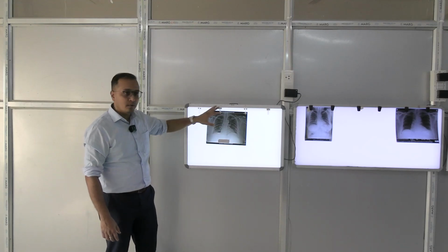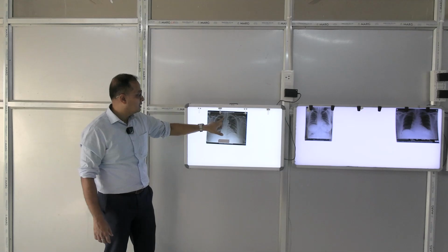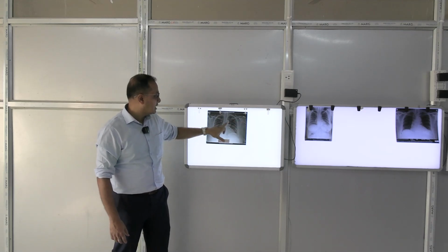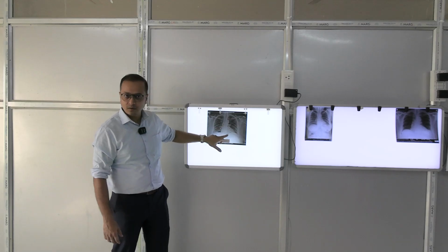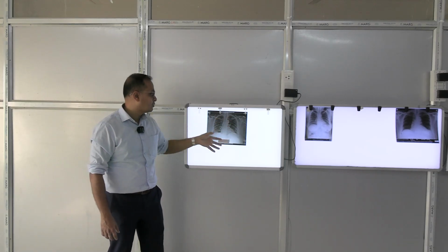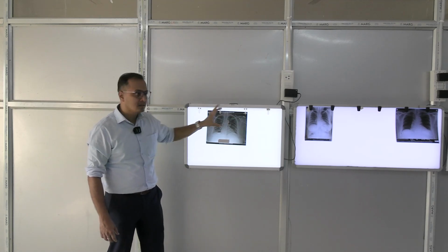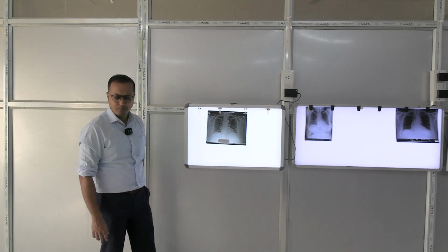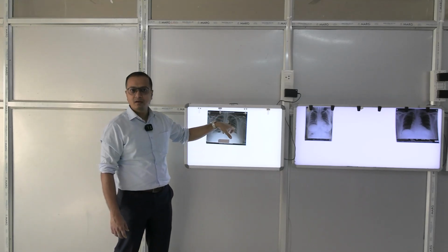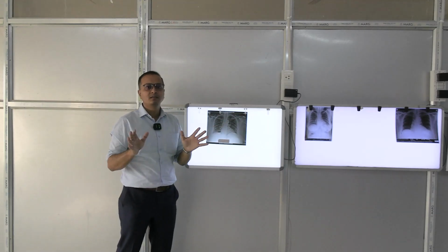So, in this particular X-ray, as we are seeing here in these views and plates, what kind of things are we going to see? These black shadows, these ivory shadows, and in between, the mediastinal shadows. The mediastinal shadows are penetrated by this structure with medium penetrability. The bones, which are ivory white, have a large presentation that can be easily picked up as bone shadows, and the black shadows have the maximum penetrability because of the air present in the lung, which can be easily identified.